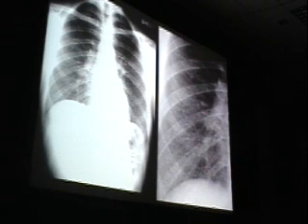So it's easier sometimes if you say small nodular opacities, because that at least leaves it open to you that other things can cause a pattern that looks very similar.